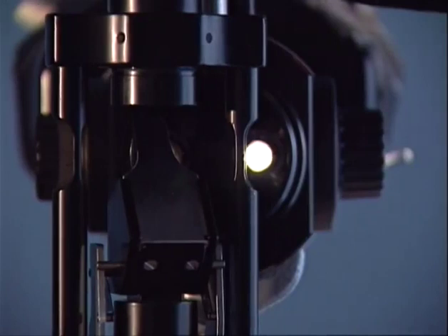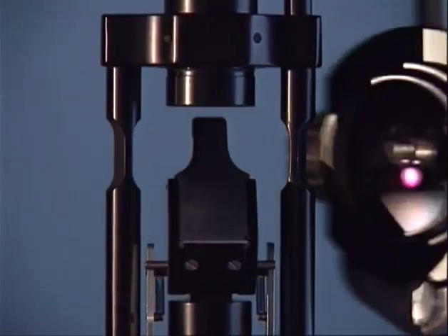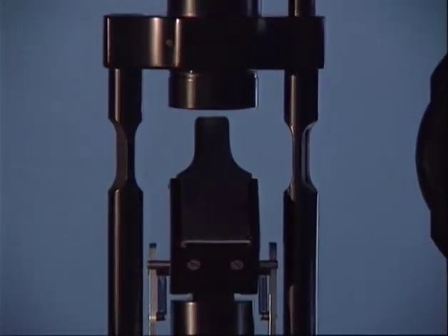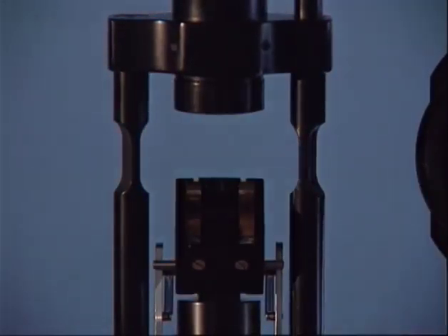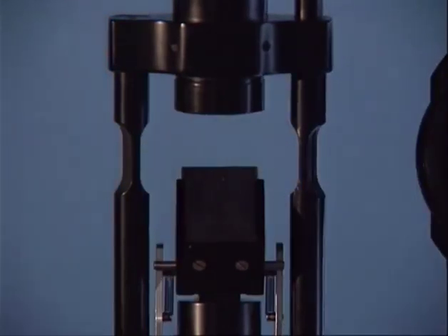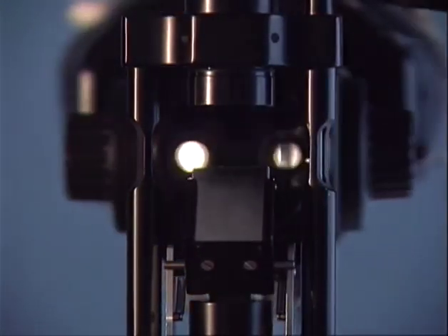To maintain binocular vision, the large mirror is removed and exchanged for a small mirror. The exchange of mirrors is facilitated by tilting the unit. The mirrors should be held at their sides because they are silver-plated at their surface and sensitive to scratching. The small mirror never obstructs binocular view.